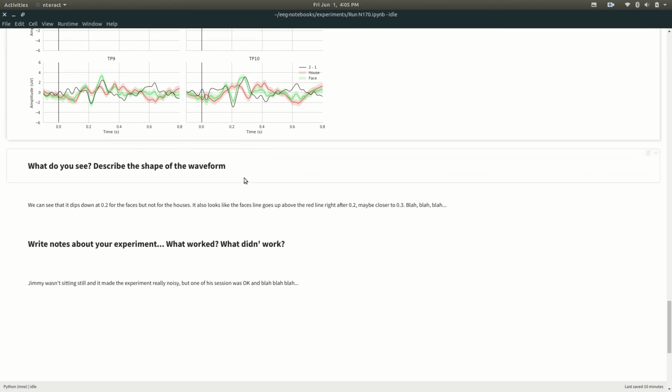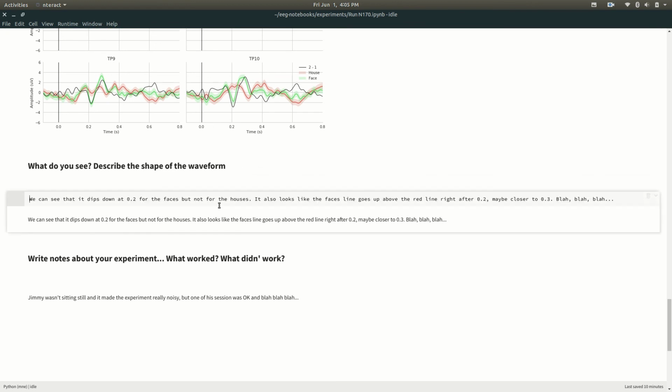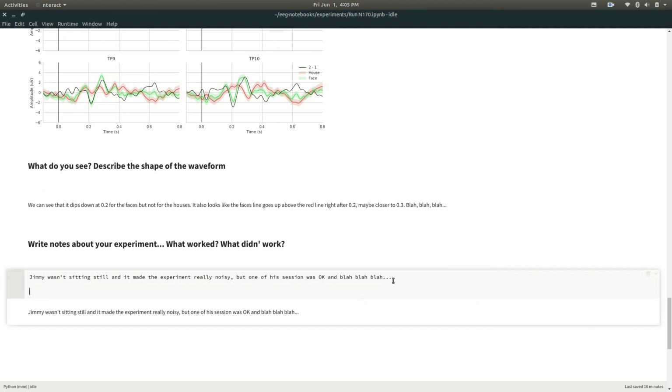And at this point, once the experiment's been analyzed, the students could type into these text boxes whatever they need for their notes. And the cool thing about this is that the students can save these documents and submit them to their teachers, and their teachers can grade them. And that's about it.